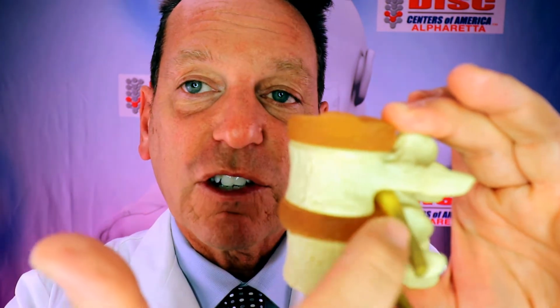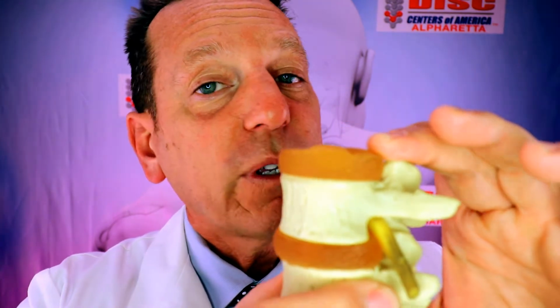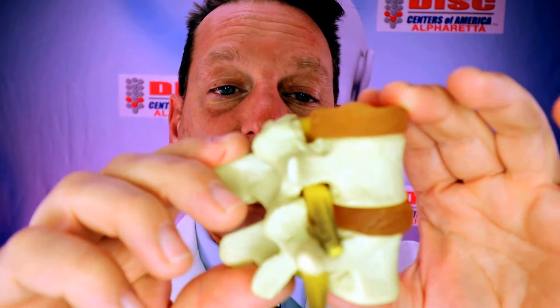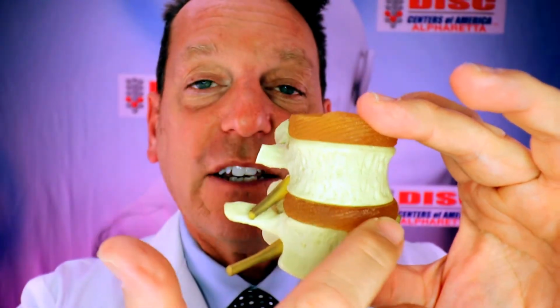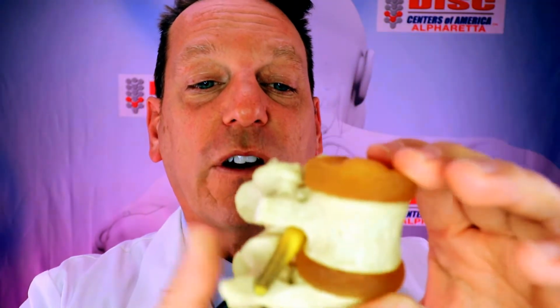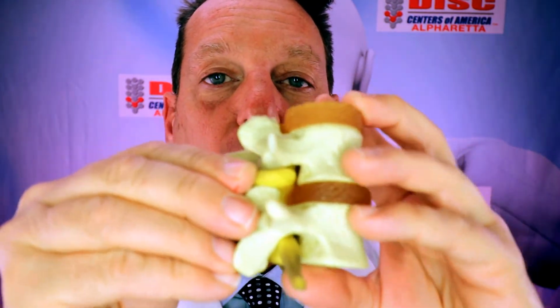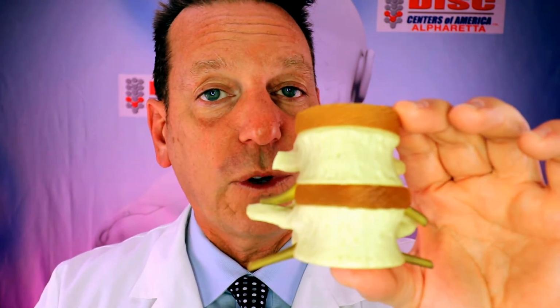And when we look at these structures right here called the intervertebral discs, they're nice and thick. Really one of the major jobs of that disc is not only to support some of the weight of your body, but to allow motion in the spinal column and act as a spacer or a shim so that the bones get pushed apart far enough so that the hole right here where the nerve comes out is big enough that there's no pinching or pressure on that nerve. So that's the way it's supposed to work.